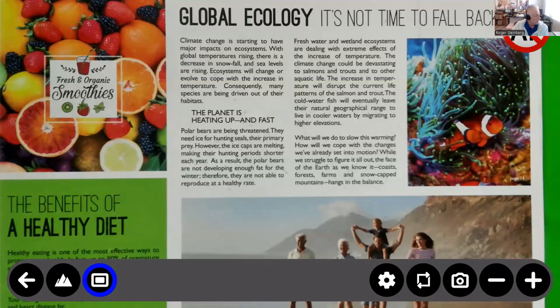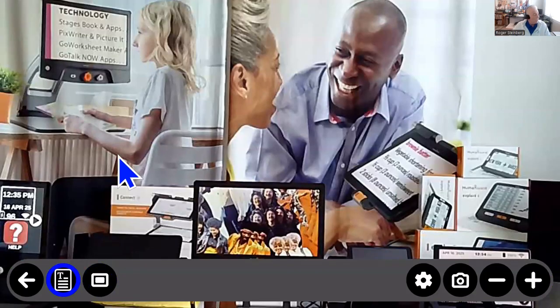I see Brady's asking if I'm using the Solo 8. I'm going to go into that in just a moment. Brady, I'll explain that to you. In fact, since I'm doing that, I'll go ahead and switch to my distance camera here.